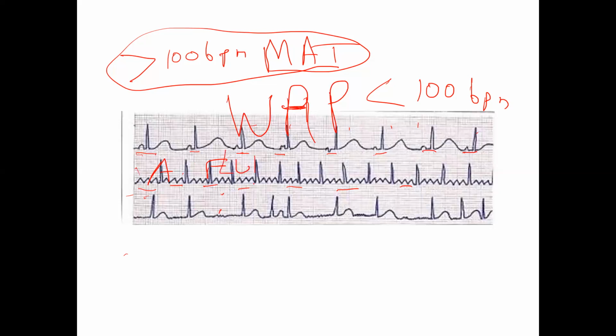Flutter. Now this one is completely irregularly irregular. There is some type of quivering in that baseline. So there is the atrial movement and depolarization, massive circuit reentry or massive multiple foci. So what do we call this irregular rhythm? It's definitely not ventricular. It's not junctional because there are P waves, sort of, or attempting P waves.